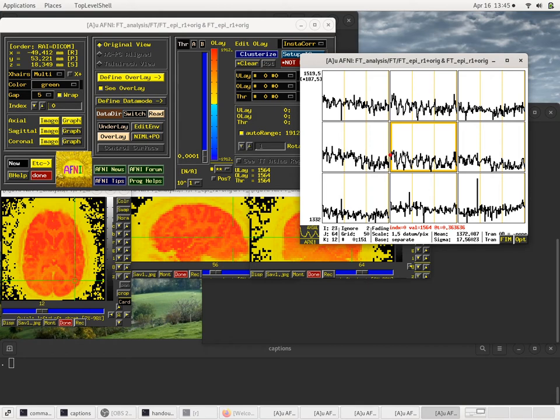they are still integers, and if the values only went up to like 100 or 200, then you can only tell the difference between 100 and 101. You can't tell anything smaller, and that difference between 100 and 101 is like a 1% change, and that's too big. So you've lost numerical accuracy.